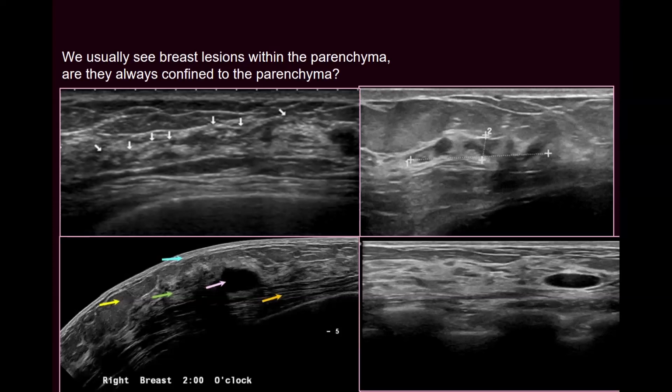Yes, if a terminal duct lobular unit is left between two layers of superficial fat, we can see the lesion between the fat.